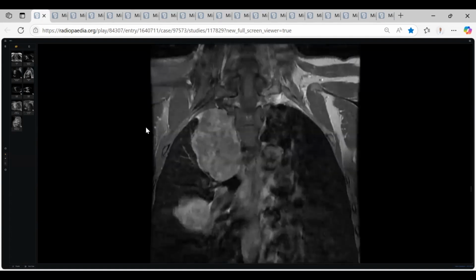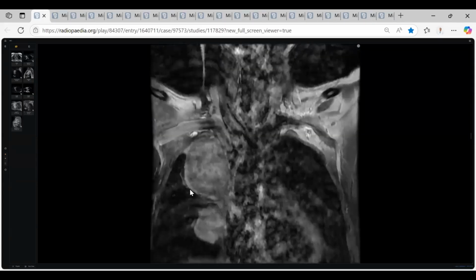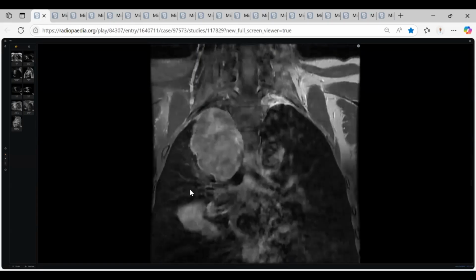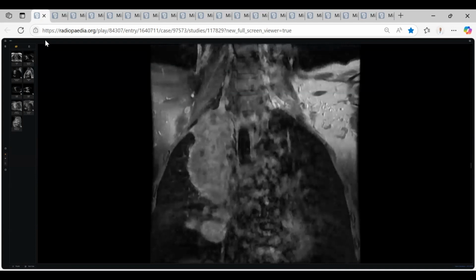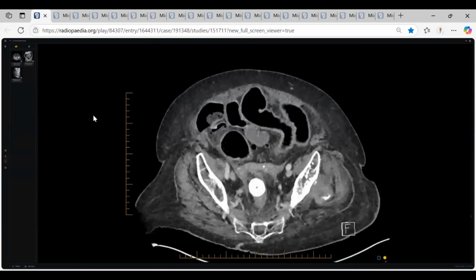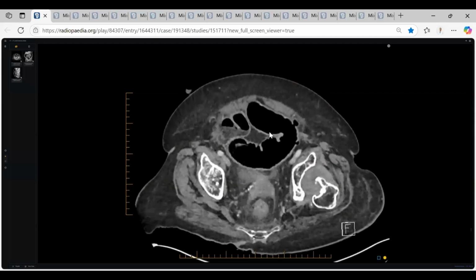Second, and this is a very important detail to be mentioned in the exam: see the very long abutment here. I think the whole length of the superior vena cava is indented by the tumor. Very long contact distance. Number two, indentation. Number three, more than 90 degrees abutment. I think this superior vena cava is almost invaded by the malignant thymoma. Thank you, doctor, so much. Take all this home message. These are very important notes. They can help you so much, all of you, within the hot viva seat. Okay, my colleagues. Next candidate.